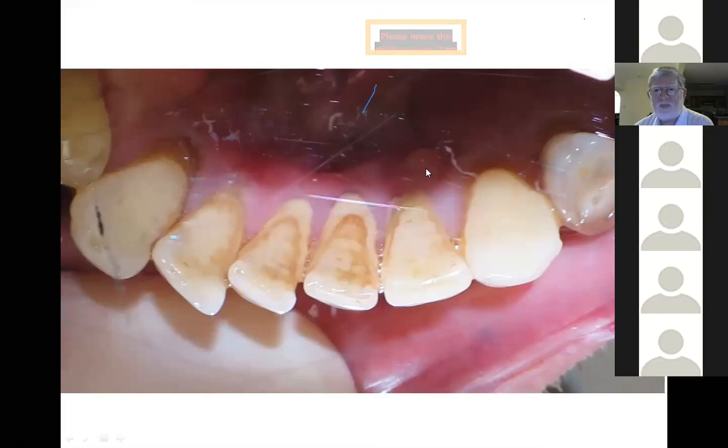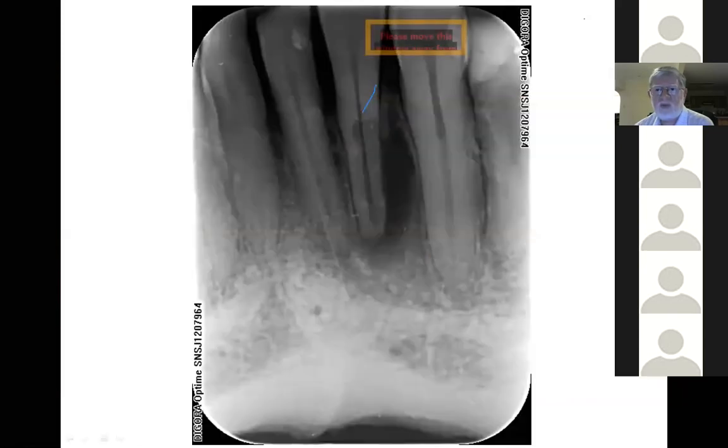Little gum boil there, lingual to the 32. And that's what's happened. We saw one where there was this massive internal resorption happening on that 3-3, and it was happening quite aggressively, quite high up. This is happening down in the lower 2/3 of the root with a massive lesion. Wasn't easy to get this tooth out because, as you can imagine, the tooth at that stage was very, very friable, eggshell thin.